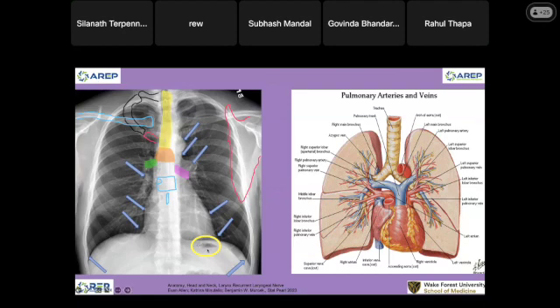So this is the air in the stomach. All right, do you see this structure? Let me stop. I'm talking about this structure, the stomach, just right against the diaphragm. You can see that there is an air fluid level, because the person is in an upright position, so you see the air fluid level. The stomach is filled with air and fluid.